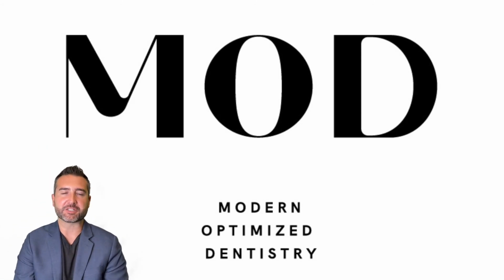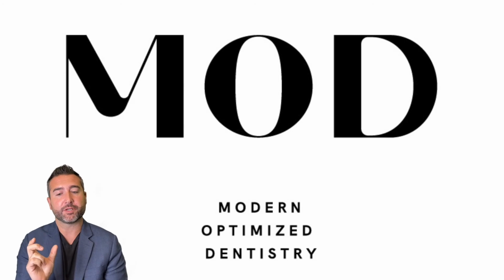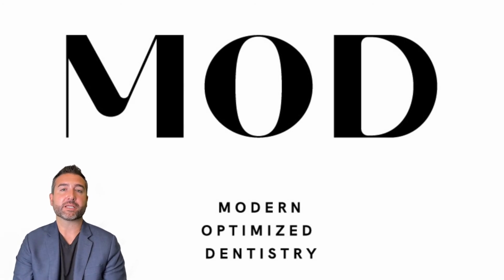I'm so excited. So now it's super easy to be able to delete these and basically 3D print the model to make a positive pressure suck down to make a retainer before the patient ever gets debonded, which saves a lot of chair time. So let's do that.